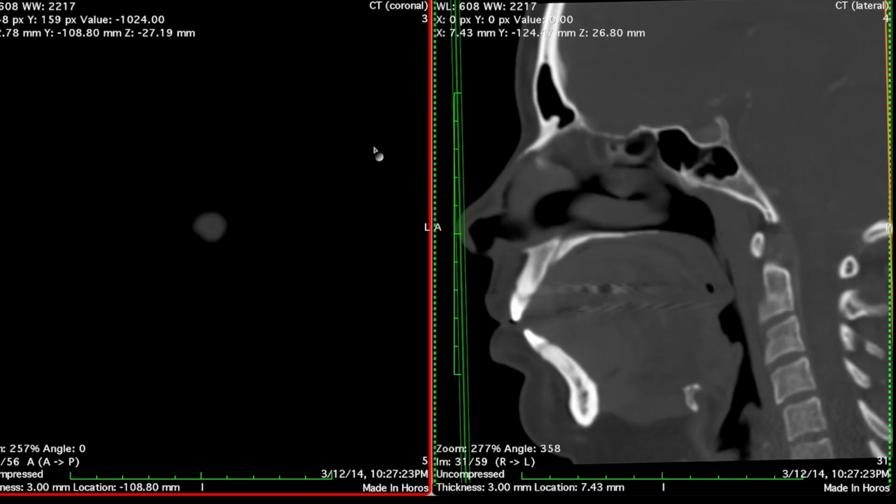The skull is a very irregularly shaped object, and it's filled with air-filled sinuses. And when you're looking at it on CT, which takes a lot of straight slices, either in coronal, sagittal, or axial views, it can be hard to appreciate the actual shape of these skull bones.